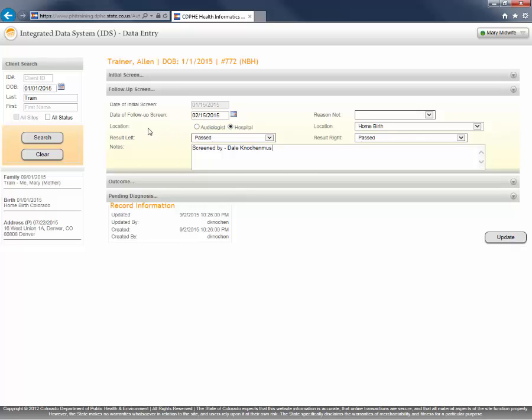If perchance there was a follow-up screening performed on this baby that was done by an audiologist, I would just go ahead and click on audiologist.